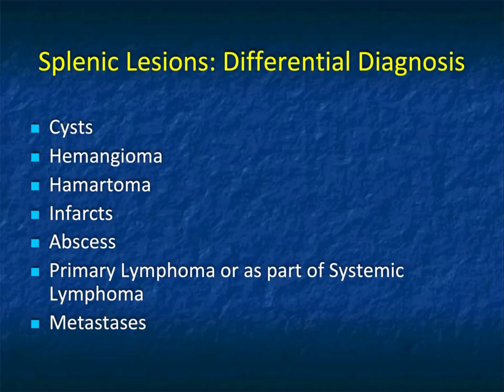With splenic hemangiomas, that's not the case. Hamartomas are also typically incidental findings, but they tend to bulge the splenic border and appear better defined on venous than arterial phase imaging. They're slightly vascular arterial phase, but sharply marginated typically on venous phase. So although an incidental finding, I often can be certain what they are. Infarcts, again, patients typically have a history, maybe endocarditis, but often have other findings. An old infarct, okay, that's not uncommon. There's a little bit of scarring in the spleen. That's fairly easy. Things like abscesses or lymphoma or metastasis, typically the patient will have clinical symptoms. It's not really an incidental finding.